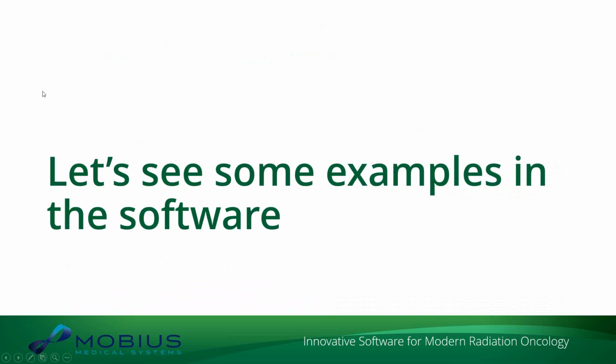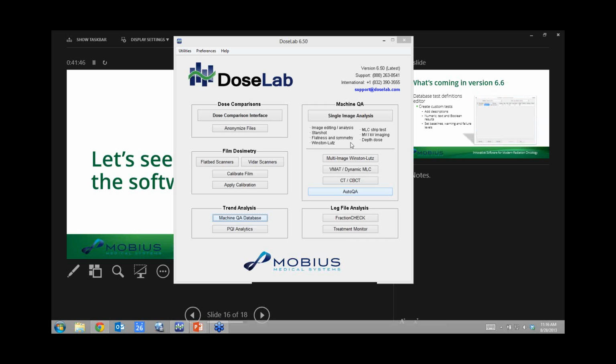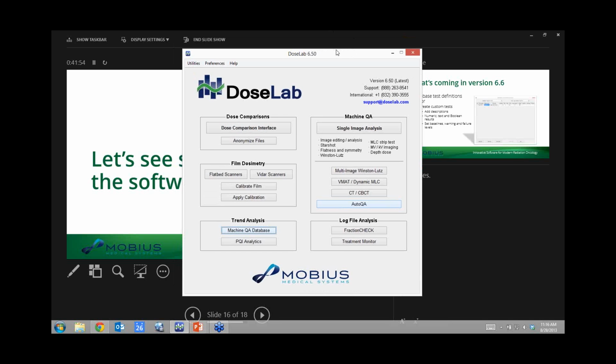So I will go ahead and pull up the software here. Give me just a second to do that. Show my screen 1. Okay, so I'm going to minimize that for now. There we go. So hopefully everyone has seen screen 1 here. Actually, I've got another computer here that I've got up just to make sure that everyone's seen what I expect to see. Yep, okay, good.